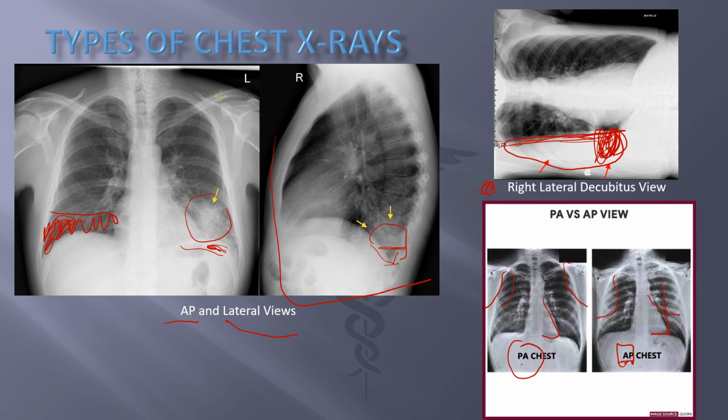So those are the differences between an AP and a PA imaging modality. But most commonly, it will be the AP that you'll see in the ICU setting.